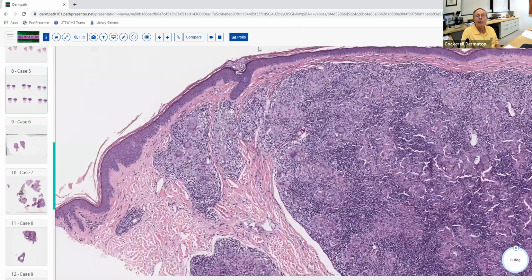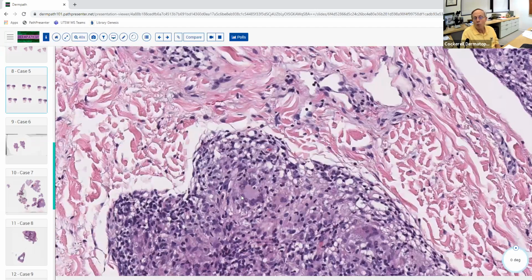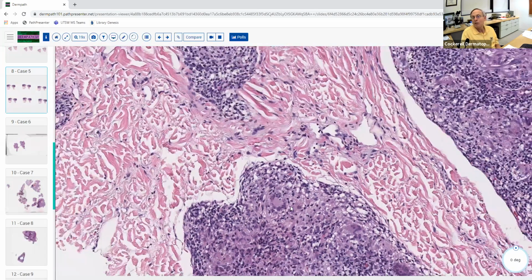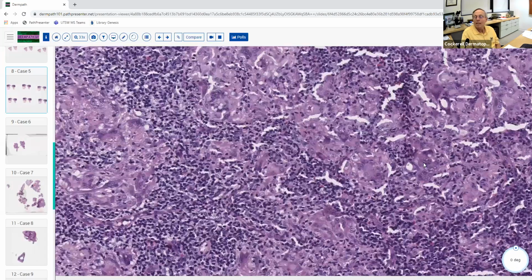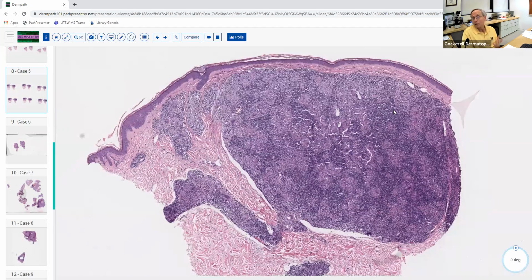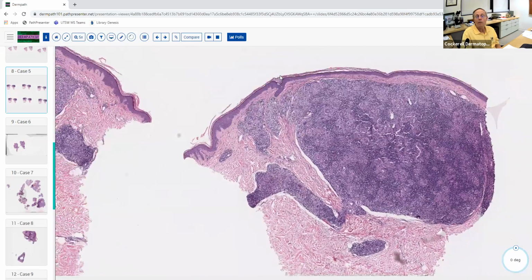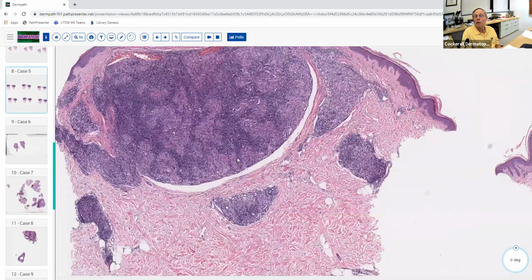If you just had an area like this, you might say the differential diagnosis includes sarcoid here, but usually you don't get the large giant cells, at least not this many, and you almost never get this many lymphocytes. So if you see a round nodule that you described, which you can see in sarcoidosis also, but it's got this other inflammatory infiltrate, you should be thinking about a foreign body reaction and then maybe polarize it. So that's good, you're exactly right. It was granulomatous inflammation, and that's the way to work through that.